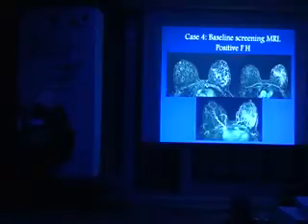As you can see, this is the enhancement. As in the first case, we have here more or less clumped enhancing foci that are clumped together and actually spread out through the lower half of the breast, in comparison to the right breast where there is nothing. One would say, okay, this is an adenosis. Yeah, but adenosis is usually bilateral disease, although it might be in one side more than the other. But here, no. This is quite unusual, that we see this pattern of enhancement.